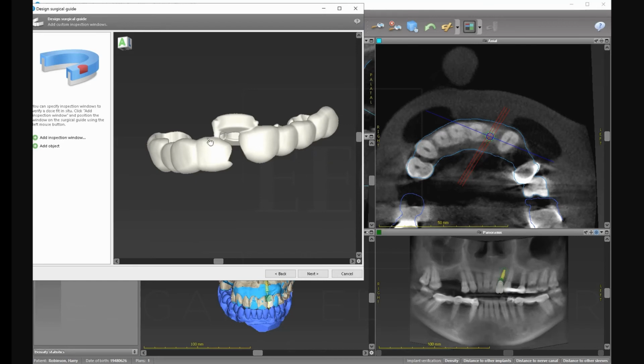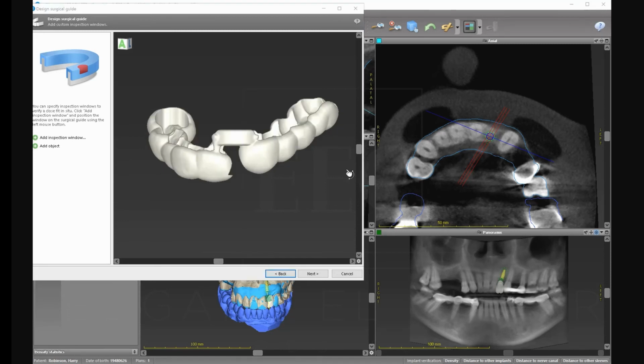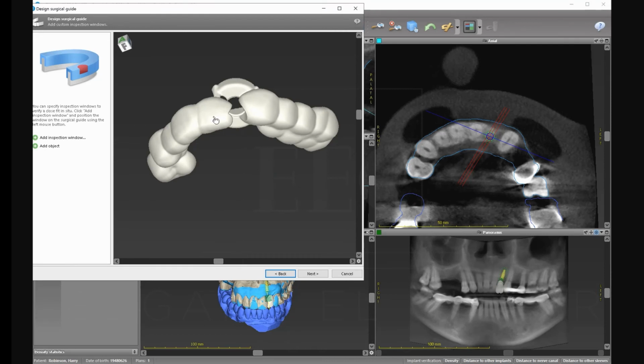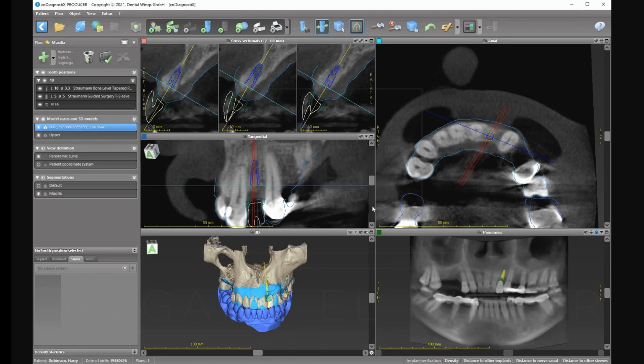So now I'm going to go back to Mesh Mixer and fix it. This is a problem, but you know, nothing is perfect. But if I go back to 2.8, I eliminate all this problem. So I'm going to cancel all of this. No, I don't want to save it.